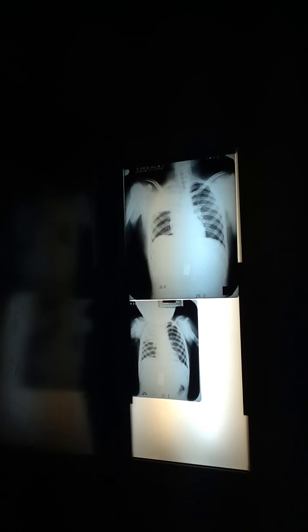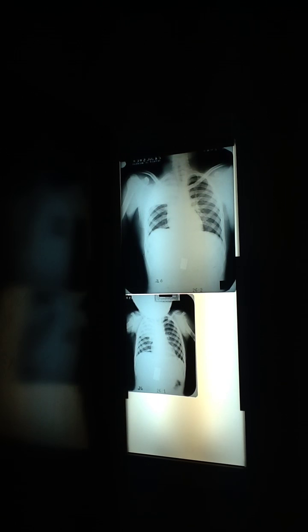So is this. Much smaller patient, yeah? This is a lobar pneumonia. To have an entire lobe completely opacified like that is likely a pneumonia, and likely a bacterial pneumonia. And these are going to be very sick individuals. Can you tell the difference on the radiograph between viral and bacterial? No, you can't. Even viral can do this. It's uncommon for viral to do this. Even viral and mycoplasmal, we lump them together.